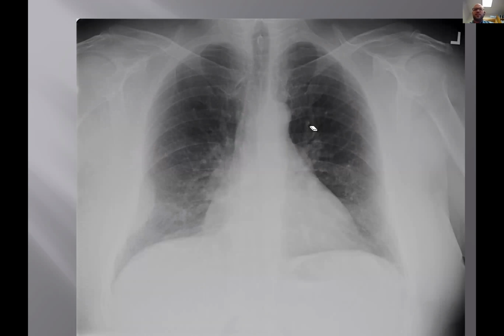Take a look at the case. So the same patient now, and again, here's the right, and you can see here, well, I didn't draw it right, but it's really a smooth, convex abnormality. And this is called, and you should know this for the quiz, an extrapleural sign.